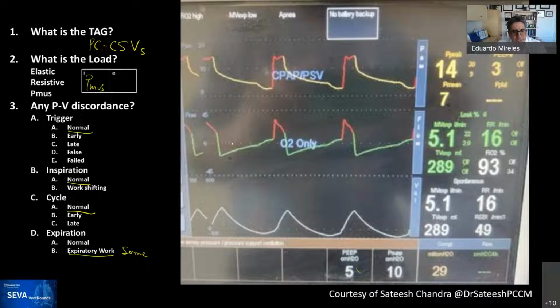I presume that this is a second, so 1, 2, 3, 4 seconds, and this is the baseline. This is 0 baseline. We'll come to that. But it could be either normal or increased resistance just by the way it looks. The peak flow is decreased, and it takes a long period of time to get back to baseline if we consider this 1 second of time, and this is 1, 2, 3, 4, 5, and we're gonna talk about this little hump over here. So either normal or resistive would be my two options. Steve, does that make sense?